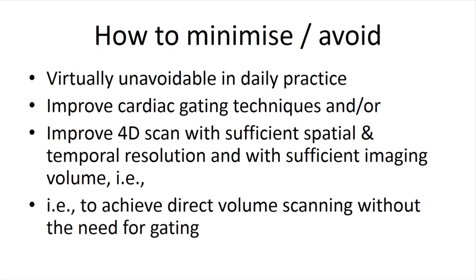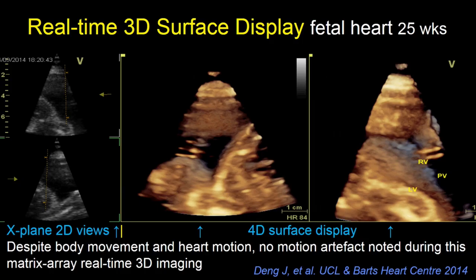Is wavy artifact avoidable? No, because it's a fundamental problem of the technique itself, so we have to be very cautious. So what's the future? It's to improve the cardiac gating technique, improve the 4D scan, and better use the 4D real-time 3D probe with sufficient spatial and temporal resolution and sufficient volume. You can achieve a direct volume scan without hard gating. This is an example of the future.